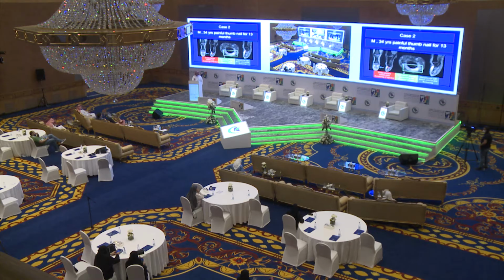Another patient, distal phalanx of the thumb, showing similar manifestations, with dorsal insertion of the tendons. This patient has evidence of even the deep layer, the nail pit pathology, edema, with periostitis or osteitis. This is the same case. A third case with the big toe, the same pathology. So this is POPP.